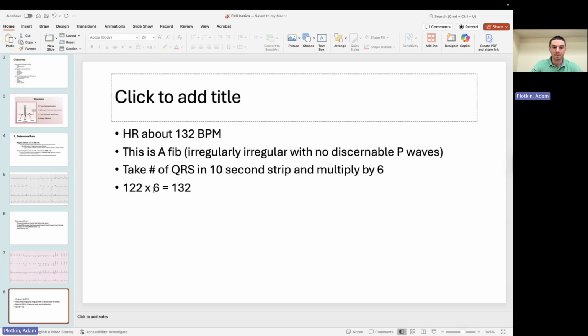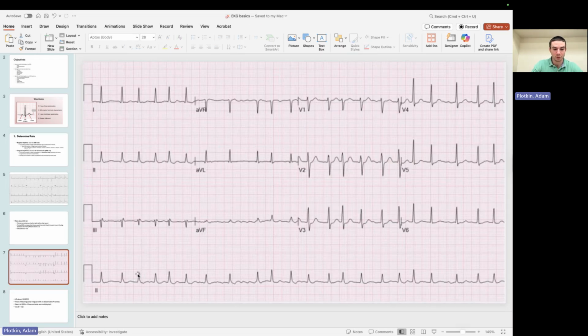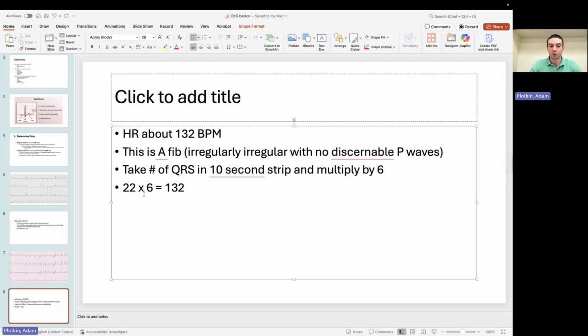So 122, sorry, that should say 12 times 6. Or did I go 1, 2, 3, 4, 5, 6, 7, 8, 9, 10, 11, 12, 13, 14, 15, 16, 17, 18, 19, 20, 21, 22. It should have been 22. So I just added an extra one in front of there. So 22 times 6 is 132. So sorry about that, but the point holds the same.